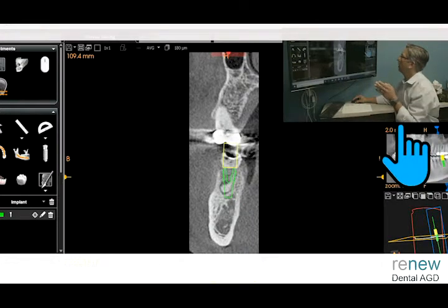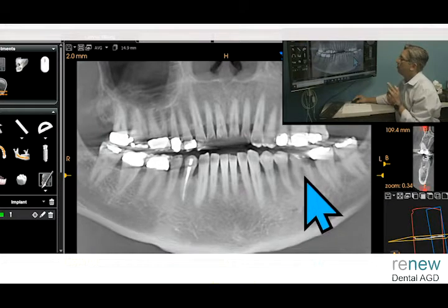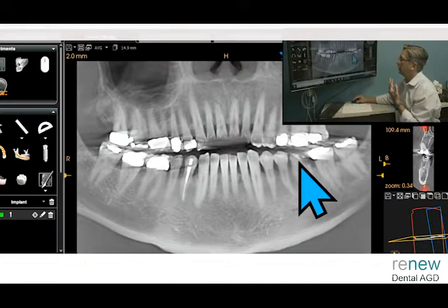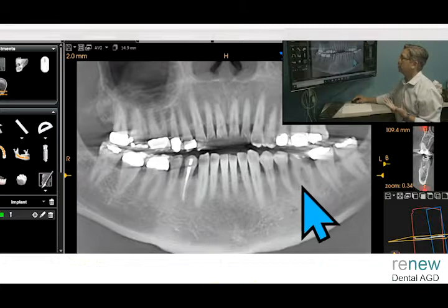So that's what I would do here, and I wouldn't do an immediate placement. It has mostly to do with that curved root coming in and hooking around. When you take this tooth out, it's already going to be a challenge, but let's say you take that out and it's a really nice socket site, all that stuff, but now you've got this septal bone.